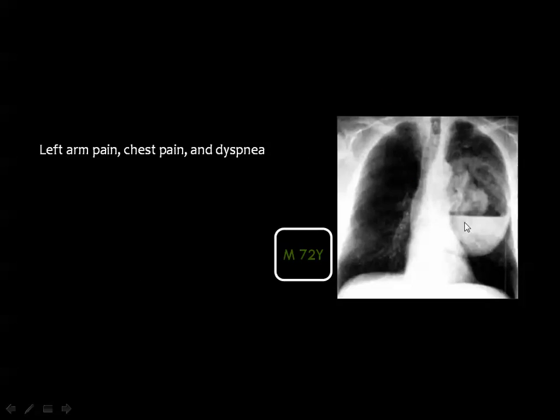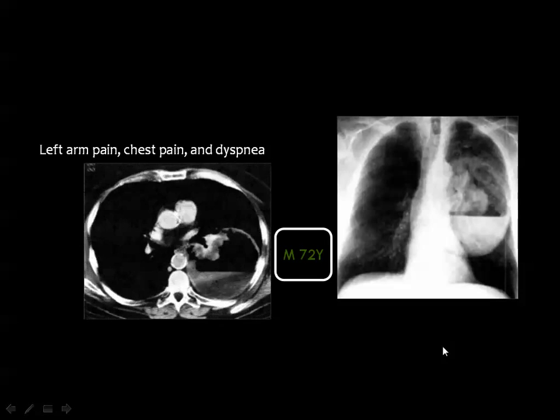And this is an example of a malignant cavitating tumor with a mural nodule and air fluid level due to hemorrhage inside the tumor. And this is the CT scan of the same case showing an irregular inner margin, and the relative thickening of this particular wall compared to the rest of the margins of the tumor.